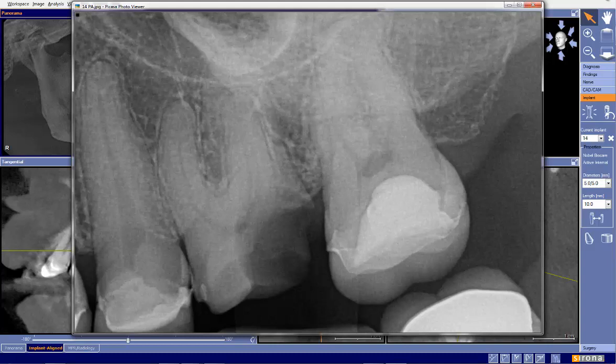So it was advised that an immediate placement may not be possible in this particular case. Looking at this x-ray, I can certainly understand, when we look right here at the palatal root, why this possibility was explained to the patient. But my key in all of this is we should never make implant decisions without looking at the 3D, planning the 3D, and understanding the implant that we're using.